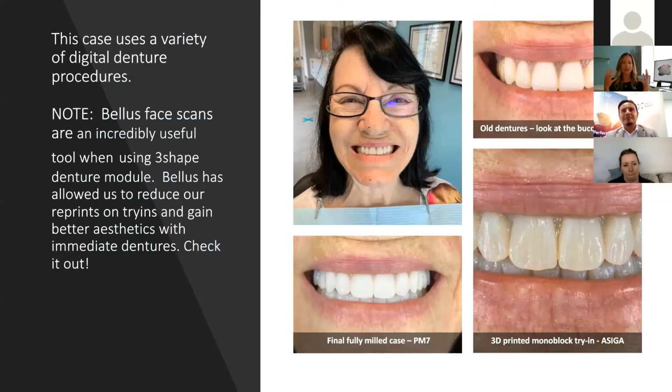You see the patient and think about what you have to work with before you even look. Sure enough, you think the two tuberosities in the back are probably sagging down, and there's probably no room. There is some truth to that on this case, so you think outside the box. If I do this digitally, I can morph the teeth and bring those necks up and correct that. And that's exactly what we did for Sharon.